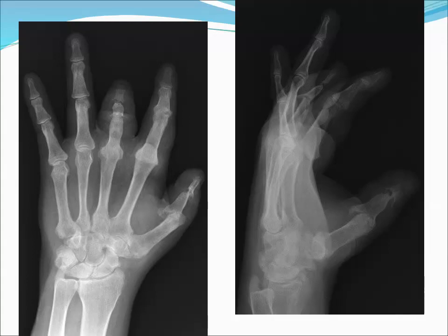Diagnosis is psoriatic arthritis. Marginal erosions characterize this disease, with erosions of joints originating peripherally at bare areas and proceeding centrally to form early mouse ear and late severe pencil-in-cup deformities.